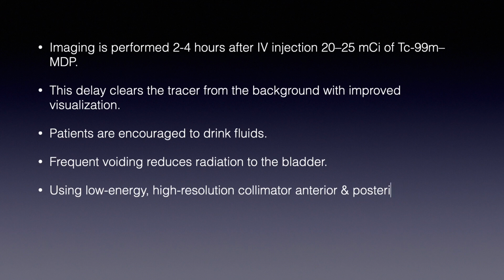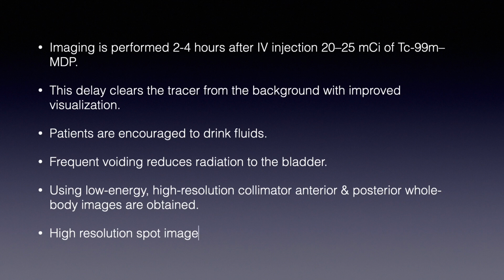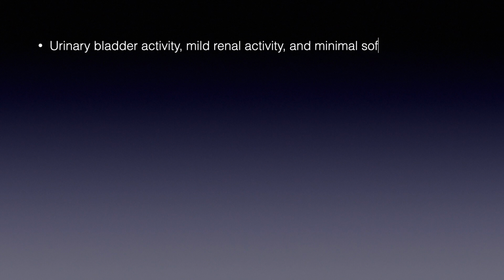A low energy, high resolution collimator is used, and anterior and posterior whole body images are obtained. High resolution images can be obtained. Urinary bladder activity, mild renal activity, and minimal soft tissue activity is normal. Bone uptake decreases with age.